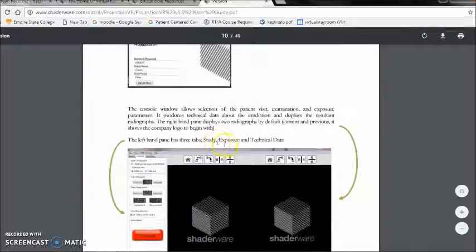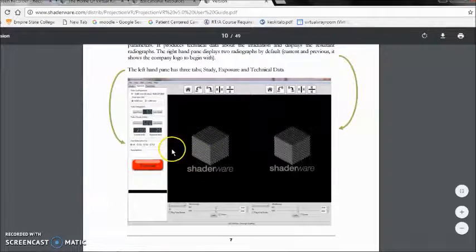And scrolling down, some more options here are our control panel, which we can manipulate the kilovolt peak here for the amount of intensity of the radiation beam. We have our milliamperage here that you can also set in seconds or milliamperage or together as mAs. We have an exposure button, so once you're ready to take the exposure, you can press this button and actually create an image. What's nice about the program is that the image that we take will show up on this part right here, and then the computer will bring up a benchmark image that the radiologist prefers.